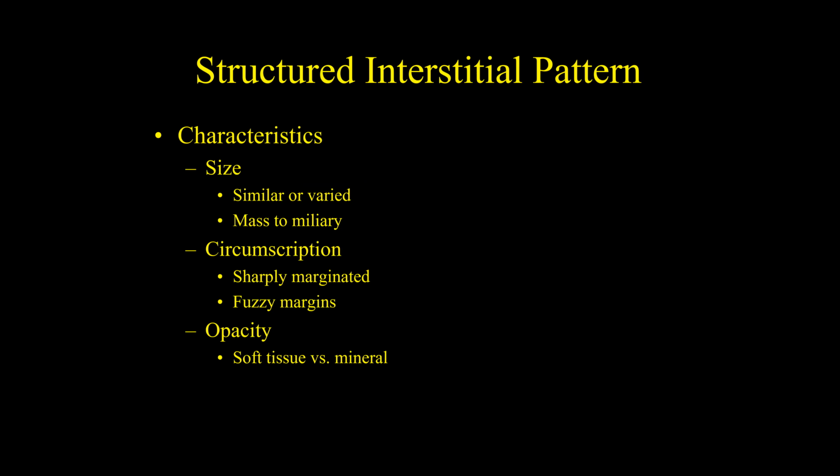If they're really small, then it could be metastatic disease, especially if they're variously sized. So you could have metastatic lung disease that came from a primary tumor somewhere else, like in the prostate or the ovary or a kidney or whatever. Then you also want to look at the nodules themselves. Look at the edges of those nodules, the circumscribed edges. Are they all perfectly round and well-defined? Or are the edges ill-defined? That might give you a hint on what is the etiology of those pulmonary nodules.